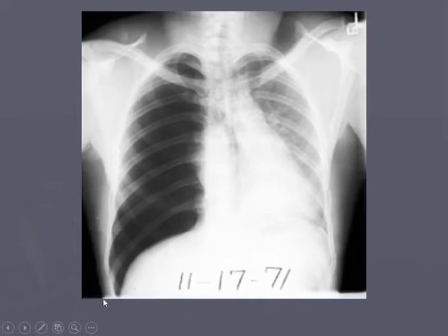Diaphragm, look how deep that costophrenic angle is. It should be up here. And what we're seeing is a hyperinflation of the lung. Here we can hardly see the diaphragm at all. E, lung markers, we see the left side. And then lung fields, again, this is very black in comparison to this, which is almost white with the atelectasis. We're seeing a very large tension pneumothorax here on the right, shoving everything over to the left. This is a non-functional lung right here. That's what we're seeing.